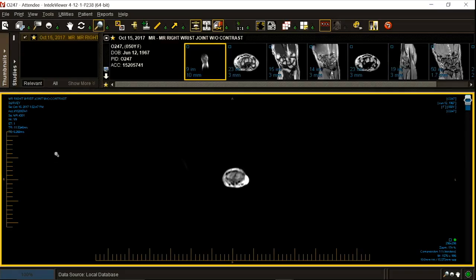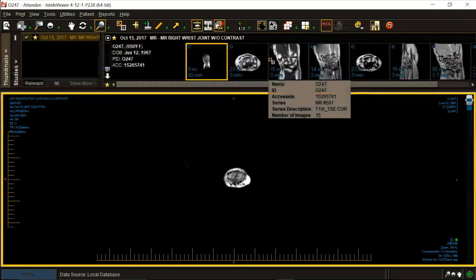50-year-old female, pain progressively worsening after a fall. So my approach to the wrist, I usually put up all the coronals first, no matter what the diagnosis, with two exceptions. Tunnel syndrome, masses, maybe loose bodies. Otherwise, coronal first.